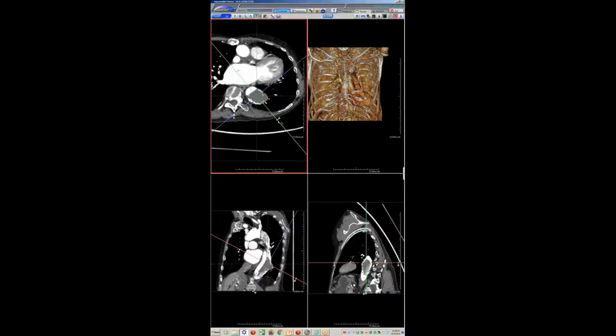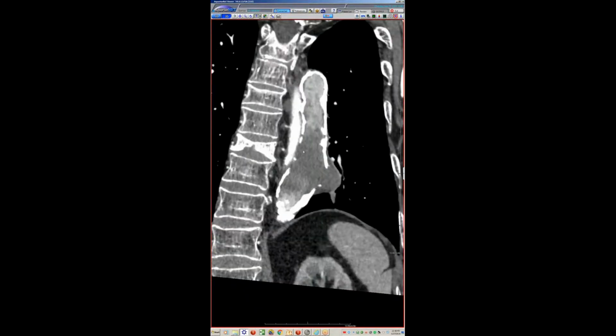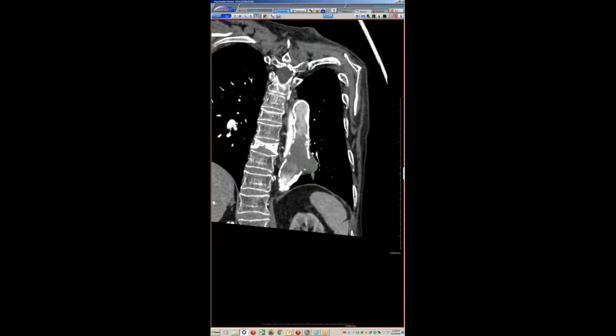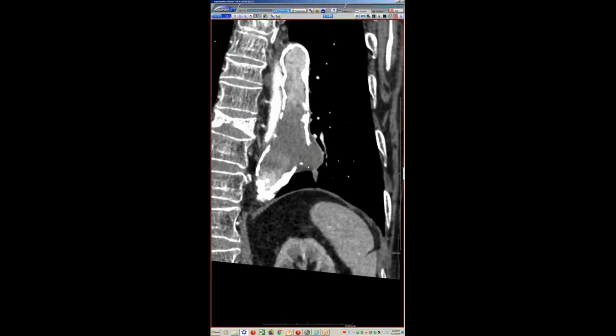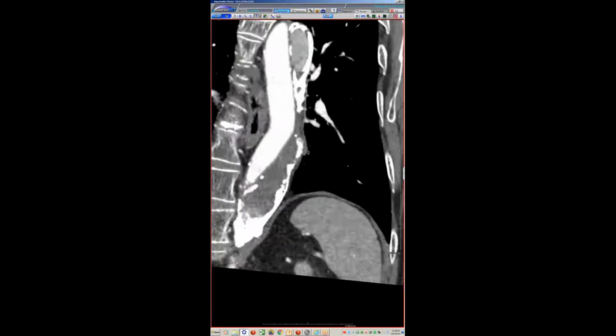I mean, that looks pretty dire. Don't you think that this is going to rupture? Oh yeah, it is ruptured. I mean, it's out, but I guess he's not in great shape. I'm always surprised about the things that I think are really bad, and they're like, yeah, we're just going to watch the guy. I've found that from the surgeons in a lot of places, things that look really bad to me, they're always like, yeah, it's not that bad. But on the chest X-ray I'll show you, you'll see the whole thing is densely calcified, and then there's just this big gap, which is a good clue that this is there.